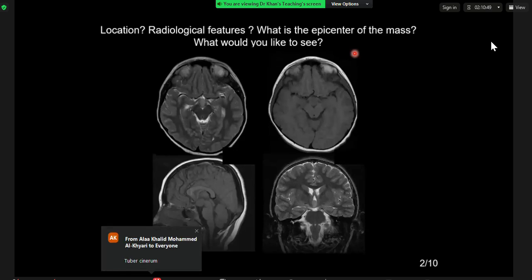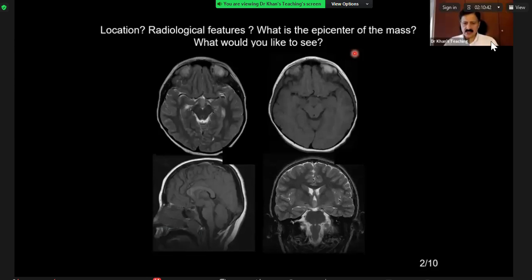Is it in the mammillary bodies? It's anterior, yeah. So your thinking process is perfect, but I am trying to listen for anatomy words. You used the word suprasellar cistern, then you were thinking aloud about the clinical side. You might not be wrong there, but right now my question is the epicenter. Can you describe the epicenter in anatomical terms? Can you describe the findings?